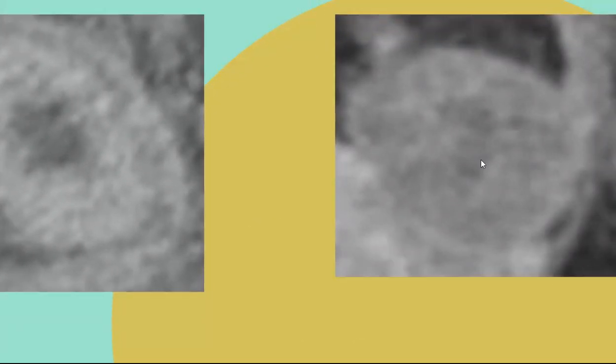Next to it, this is grey enhancement. Again, you can see the lumen, but the wall is greyer, not as inflamed, not florid like the enhancement we saw before. This is in fact enhancement of an annular tumour.